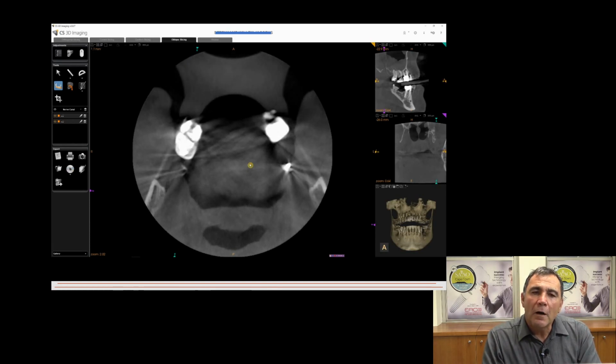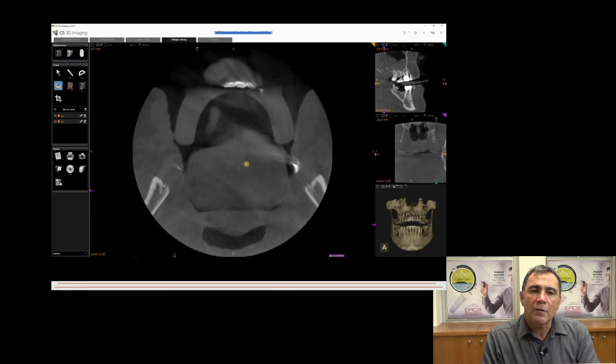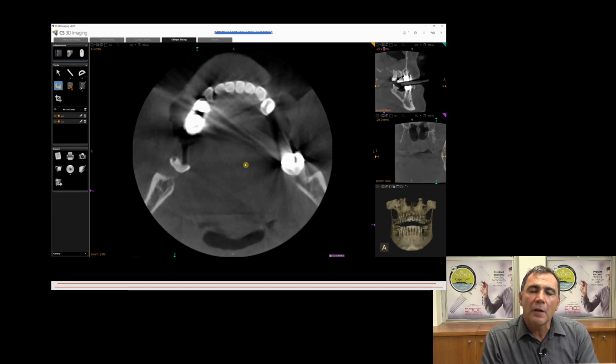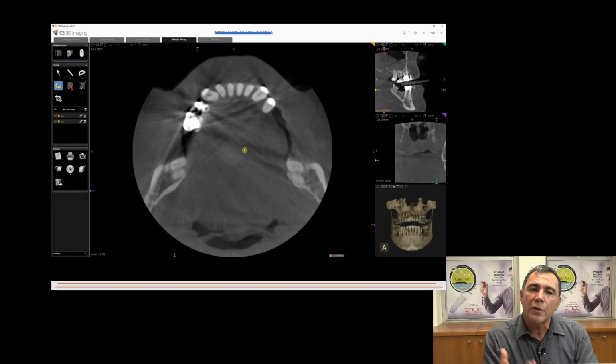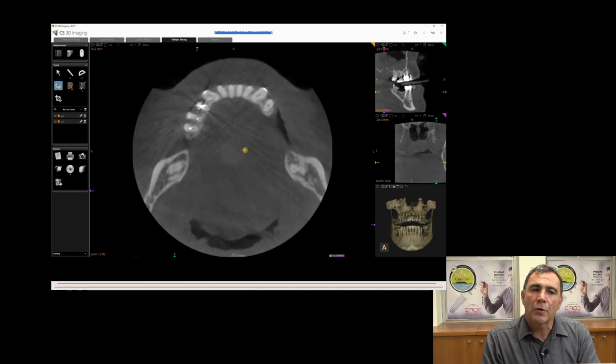And here we are going through the upper teeth, and you can see all of the scatterings. I especially took a case where there's a lot of scattering, a normal patient, not an ideal case, which a manufacturer would like to show you. And here you can see the artifacts and the stria, the beam hardening, and also the total absorption of the radiation that goes through.